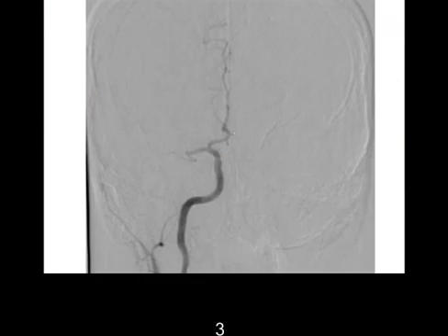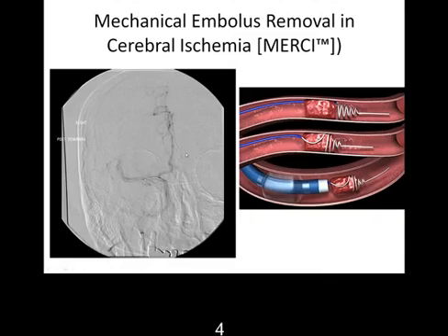For example, in this patient, this is the whole head looking at us. This person had a stroke, and the doctor injected dye and found there's supposed to be a vessel, a middle cerebral artery supplying most of the brain, and all of a sudden it's cut off here. Something is blocking it; that is a thrombus. The patient had an acute stroke and could not talk. So the patient went in there and they did something.